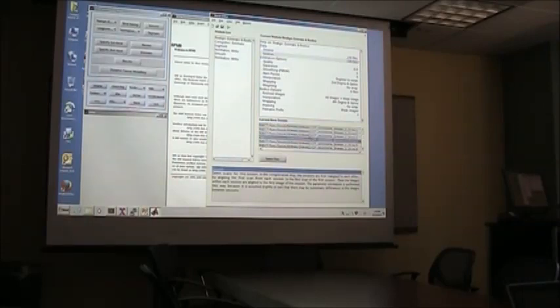And add all your data. You can just stick to the defaults and you would run it. And then, we're going to talk about this in a bit, you can also add all the other steps right away.